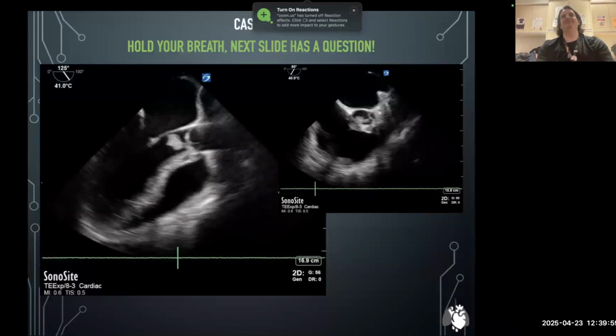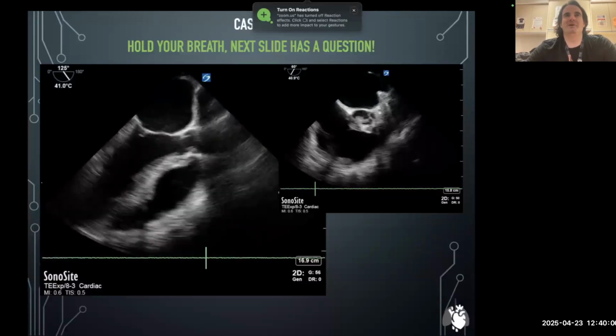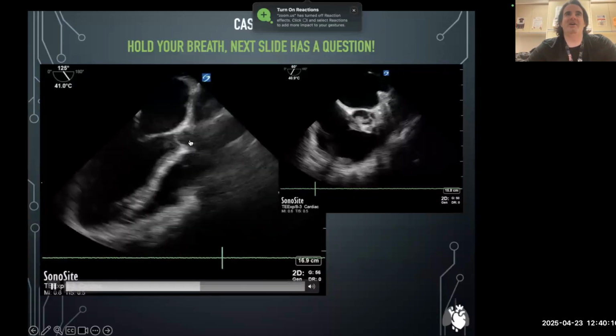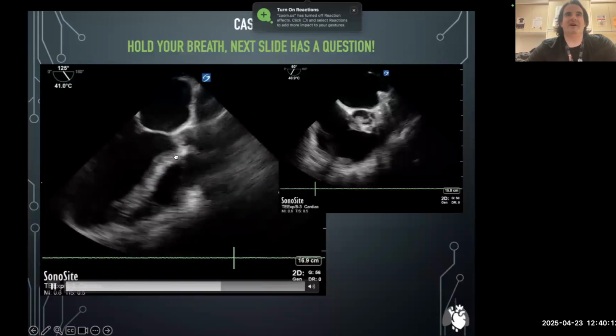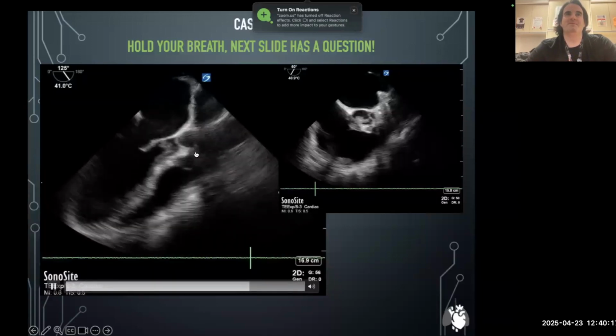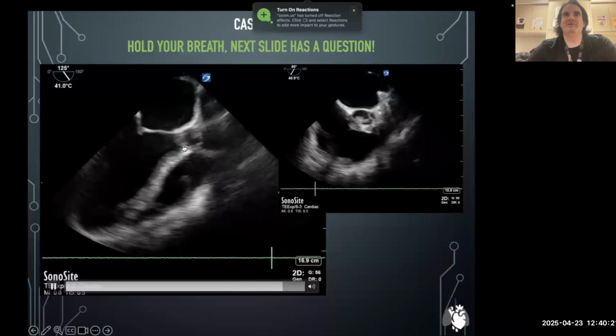Yeah, and also he's in septic shock. So we think, well, obviously, all things being equal, endocarditis seems like it'd be reasonable, right? It also crosses the valve. It's on the ventricular side, not on the aortic side. Bigger than 1 centimeter, so high risk for embolization. It's big. It's like a satellite going back and forth, right?